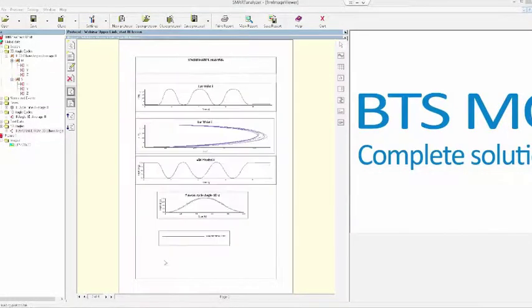And another option that I want to show you is, now we have created this page based on the test02 data, related to the data within these files. Imagine that we want to apply the same page layout also to more than one trial.